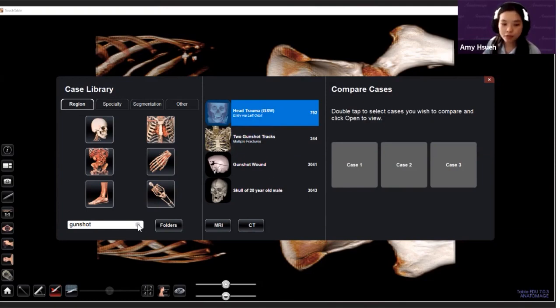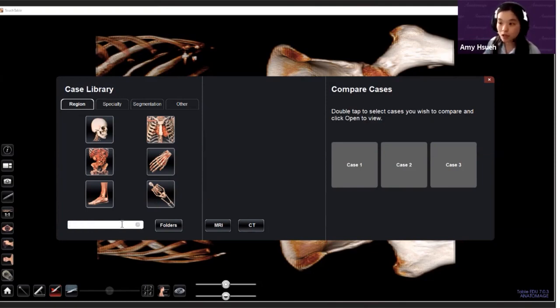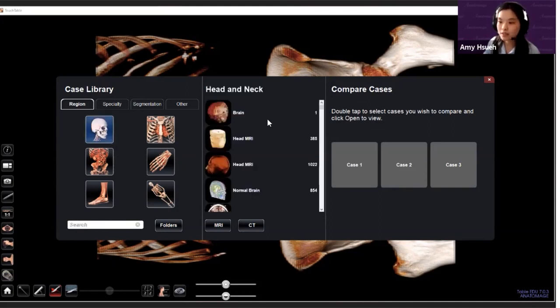And with every single table on the desktop, there should be a case library list and a case library description PDF file. The case library list will be literally a full list of the case numbers and titles of each of the cases in our case library. And the case description PDF will have the description of each of these cases located on it.